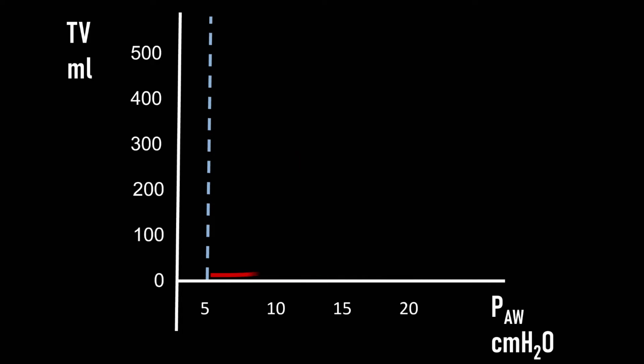What about this one? The red inspiratory curve is indicative of spontaneous breathing. It's a pressure control curve because it goes right up to the pressure limit and then it releases. This is the picture that we associate with pressure support ventilation.